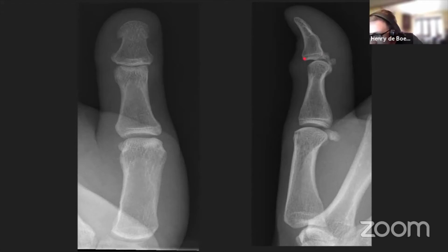And that seems to be the consensus opinion in the chat. So Jeremy's called it a mallet injury. A mallet injury, I think we'll see one later, is where you get this sort of flexion deformity, and that would be an extensor side injury. So when you get the volar plate avulsion, you can't flex your thumb, so it'll be stuck in sort of extension. And these can be really subtle, but they're important to spot, because if you don't immobilize patients with this volar plate avulsion injury, you can get sort of fixed extension deformities. So they're important to spot.